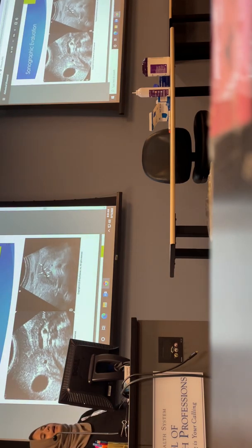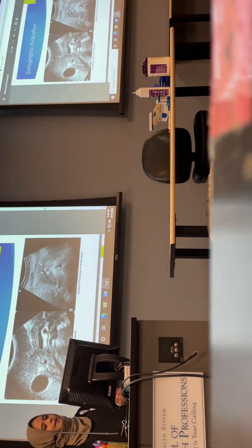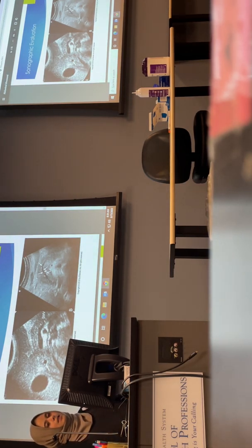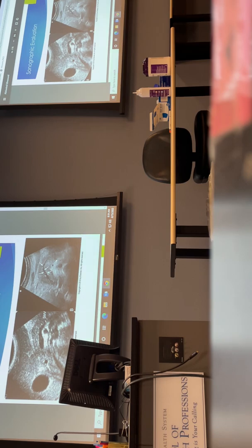Being able to tell a duct versus a vascular structure. Remember, what was one thing I specifically said? Duct versus vascular. What will happen with a duct? Correct. Ducts have tissue on either side. So if you look at image B right here, you can clearly tell that this is a duct because you have pancreatic tissue above and below. And the below is not only in the head region like the uncinate process, it's going to run behind the body, the tail, the entire way through you have pancreatic tissue.